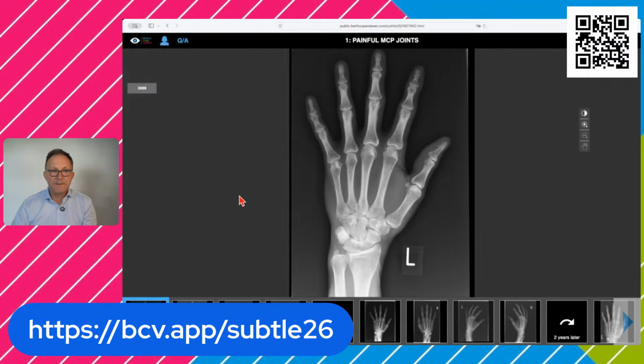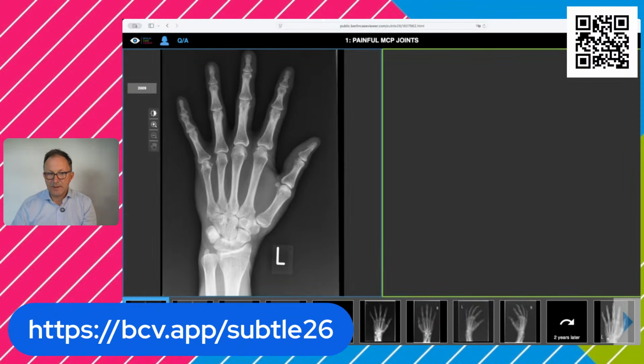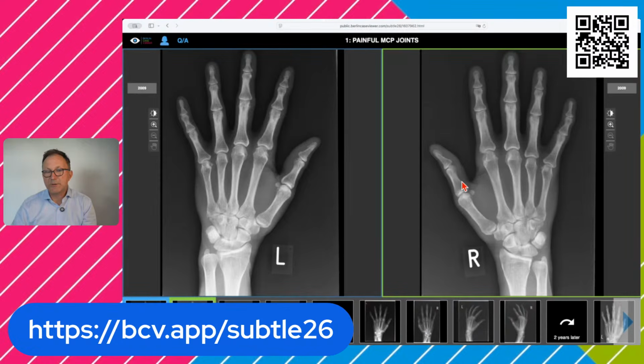So looking at the image, first presentation from 2009, it's always advisable to have both images together, to look at both images together.